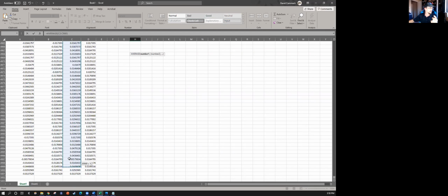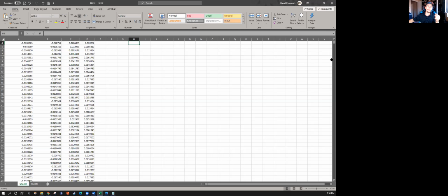All right, so we're pretty much close here to the end. There we go, 5,001 data points. We've selected it all. Don't click anything else. Now that you got that nice blue striped box going, we're going to hit enter, and that's going to return our value. We're going to double check. That should be, there we go, C2, the colon, C5001. All right, so that is your average number for your subject CNR1, concentric no resistance, for the bicep.